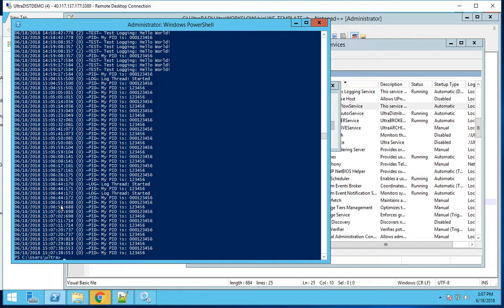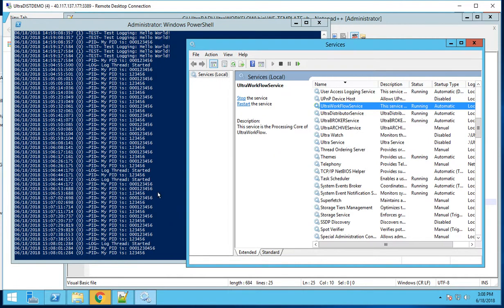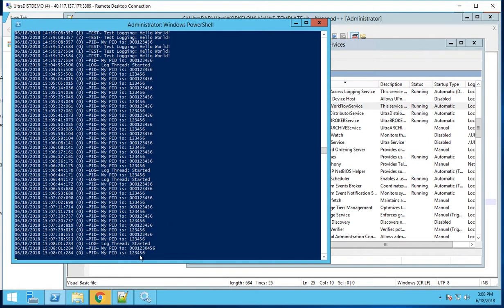I'm just going to hit Control-C on here and start tailing my file again. And we should start to see some log entries here once this finishes starting. Oh, and there it goes. It worked. So you can see that my new patient ID is 123456, but there should be a 0 in there.